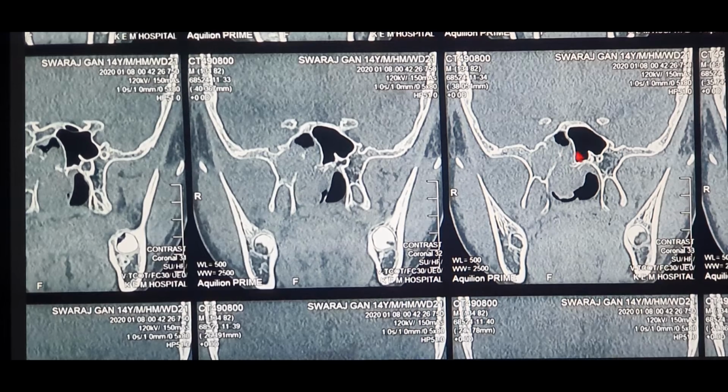So if you compare the same thing with the right side, you can definitely see that the pterygoid wedge is completely involved. Now you can look at the opacity over here is very much different as compared to the left side, which is normal. So here it is blackish gray, here it is completely gray opacification. Okay, so this is the complete JNA mass in the pterygoid wedge.